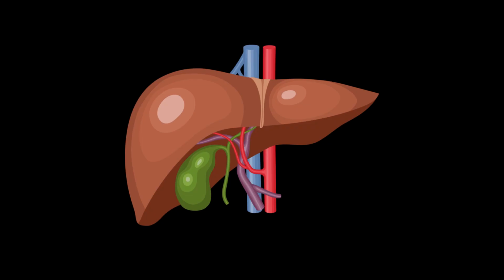We discuss them together because these are the principal organs of the right upper quadrant and because the liver and gallbladder cooperate with each other as part of the biliary system. The liver produces bile, a digestive fluid, and the gallbladder stores and secretes it.